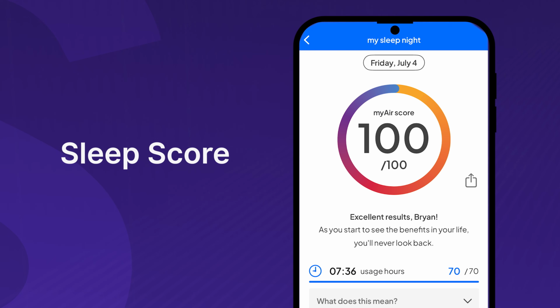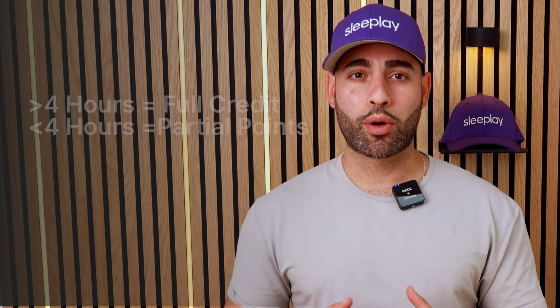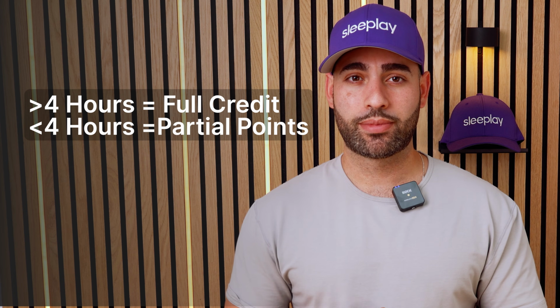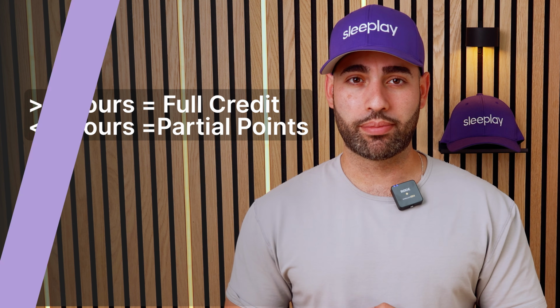Right from the home screen, you'll see a big sleep score out of 100. Here's what's inside that score. Usage hours. This is the biggest chunk of your score. You get points based on how long you wore your CPAP the night before. 4+ hours equals full credit. Under 4 hours, you'll still get partial points, but your total score will dip. The more consistently you use your machine, the more effective the therapy. This part helps build long-term habits.